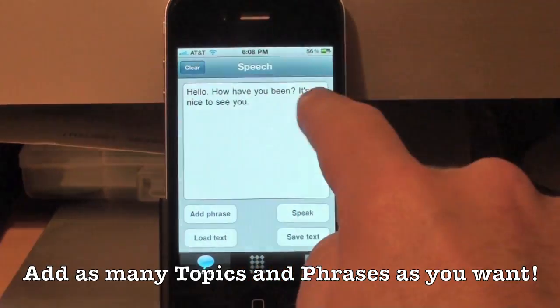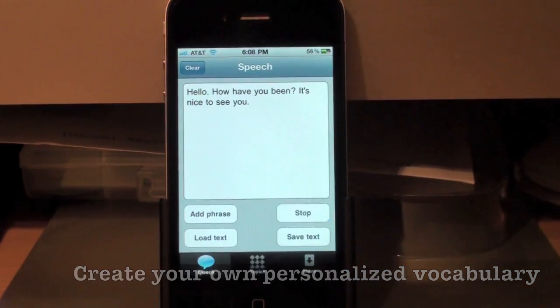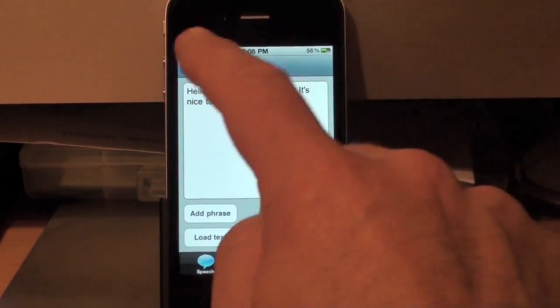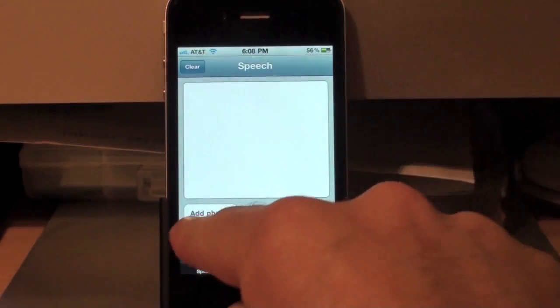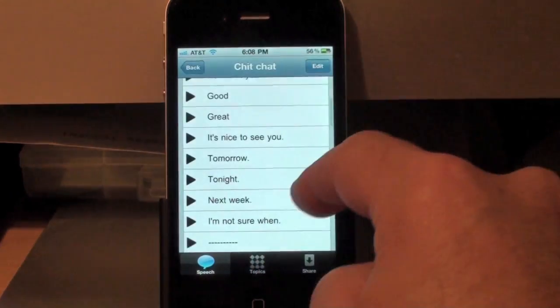Now it says, hello, how have you been? It's nice to see you. So I didn't have to retype that every time. I hit speak. Hello, how have you been? It's nice to see you. And let's suppose I wanted to, I'll hit clear. And let's do add a phrase again. Here's my topics. I'll go back into chit chat.